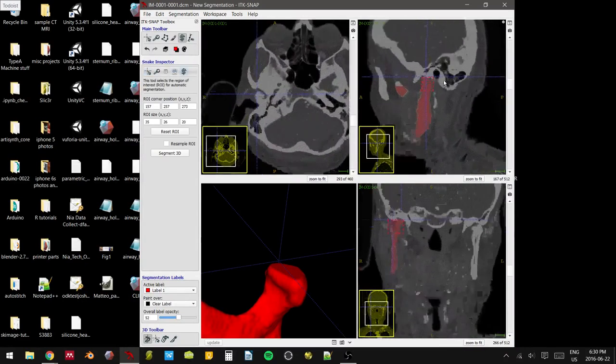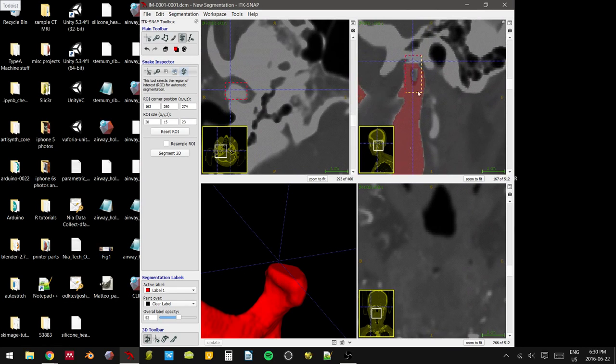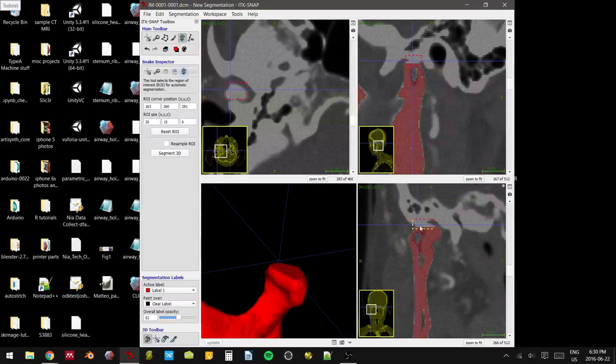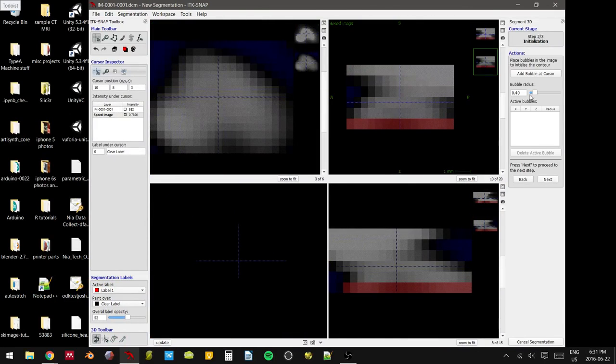So once again, let's go ahead and do that then, and finish this off properly. Zero in on what you're interested in. Just like that. Segment in 3D once again. We're going to go through that process. We're just going to have this bubble grow.